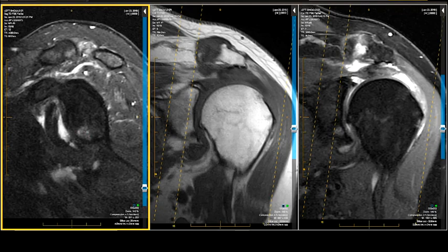So this is one where I wouldn't operate. It's a massive tear. How are you going to get the tendon over? The tendon that you have is sick. The muscle that you have is kind of borderline sick. There's fatty infiltration. You're going to have to do an acromioplasty. You're going to have to do a Mumford. What percent of surgeons would attack this case? 50%. What percent of radiologists like me would attack this case? 2%.